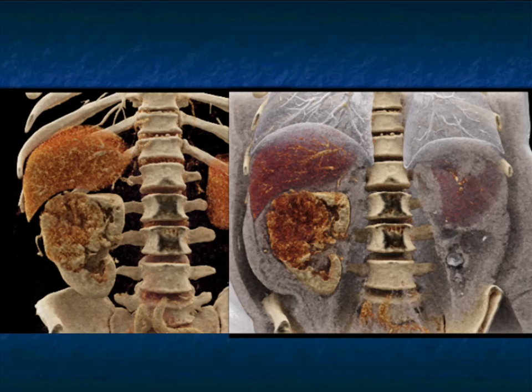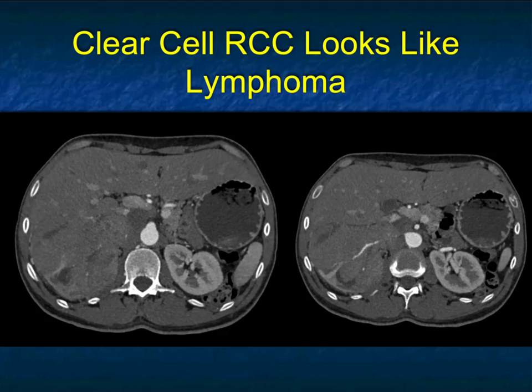Again, one thing about cinematic rendering, it really can give you very nice images and good detail, but you also can see the variability in the images I can make, which is both good and bad because theoretically you could hide things. And if you don't have experience in doing cinematic rendering, perhaps it can be frustrating.